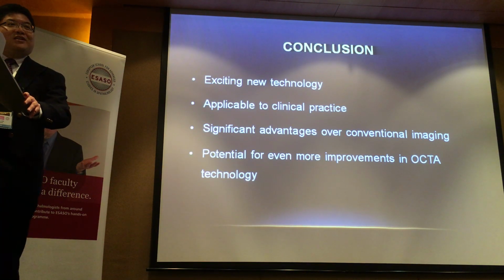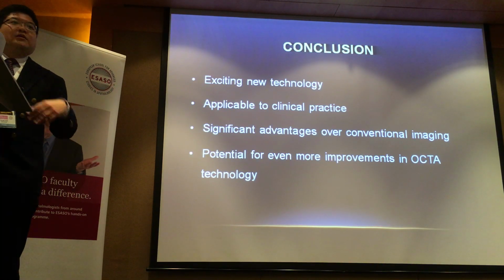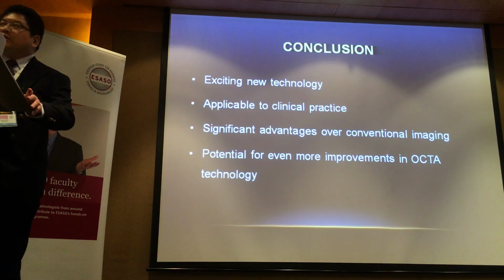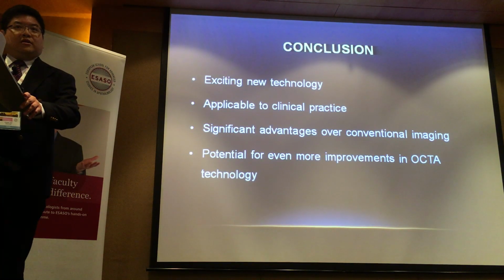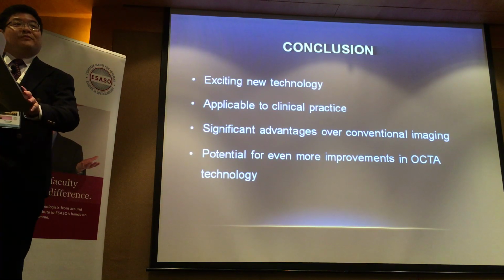In my opinion, that was just a very poor scan. Through no one's fault. There's a limitation of the patient's ability to cooperate. He was ill, remember, he can't keep still, as well as the technology as it stands today. So be very careful. Okay.